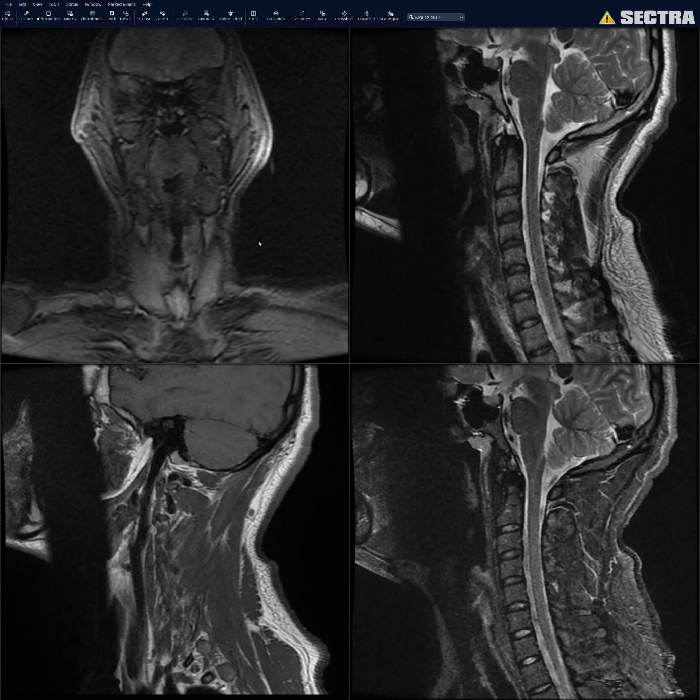In this video, I'll show you how I read an MRI of the cervical spine. There are a lot of different ways to do this. These are just a couple of suggestions.